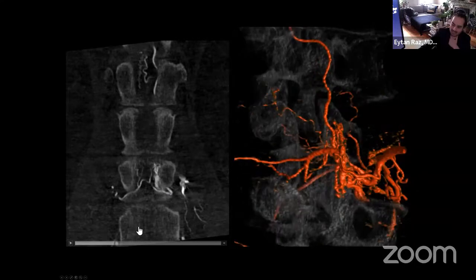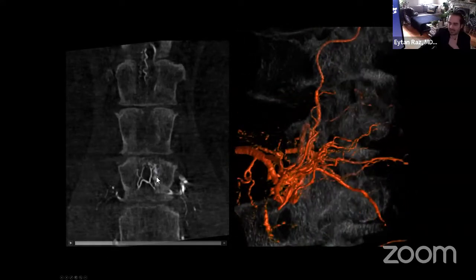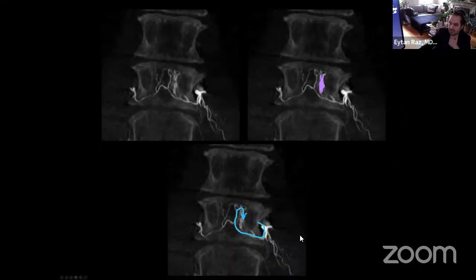meningeal arcade. Then you can follow the vessel and understand that in order to treat the fistula, you have to go up and then down, and the fistula is going to be epidural parasagittal, going up and down like this, and this is where the fistula is. Now, once you understand the route, going with a microcatheter here and getting to here is actually not difficult at all. The biggest work in such a case is to understand where to go, and which route to use. Once you identify that, this case becomes very easy.